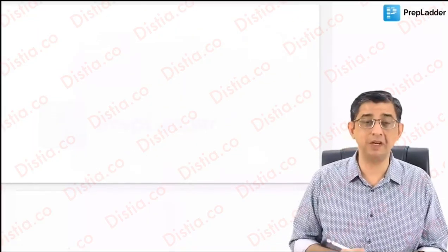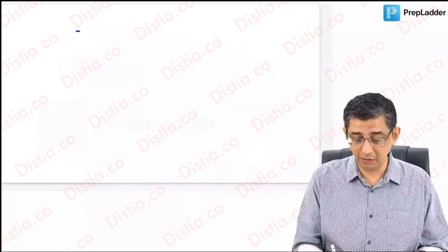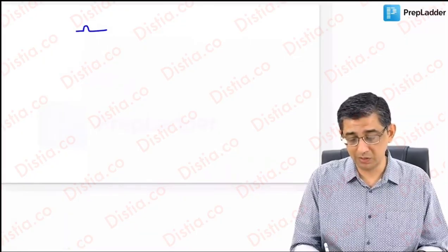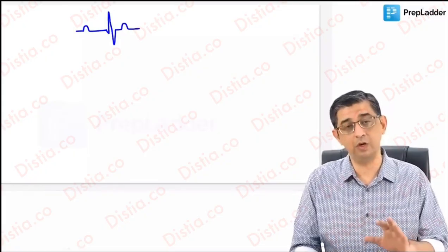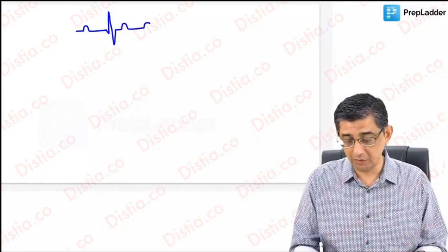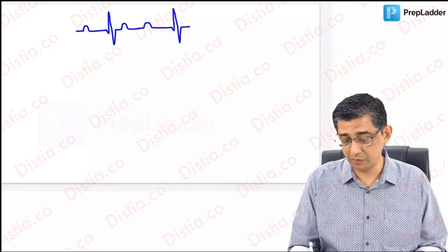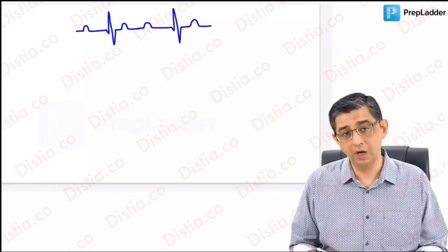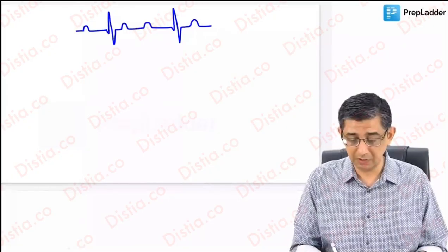I'll also mention a pediatric important cause for this condition too. You see, the main agenda that you need to understand with respect to this condition is that the number of P waves and the number of QRS complexes always match in you and me. You check out any ECG strip of a normal person. If there's going to be a P wave, then there's going to be a QRS complex, that is normal sinus rhythm. So the number of P waves will always be equal to the number of the R waves, or the QRS complexes. In this person, the ECG tracing will come like this.